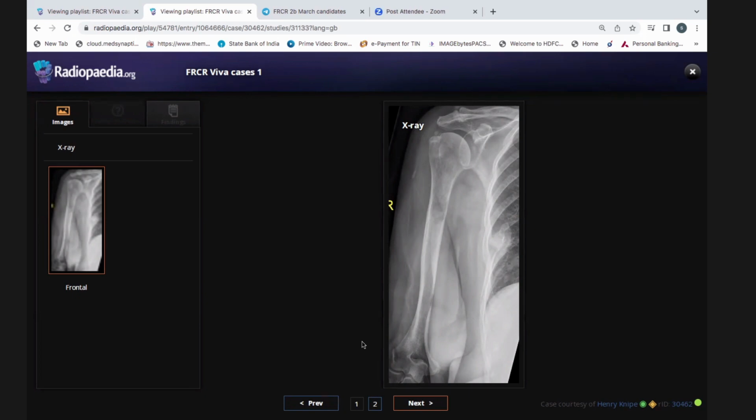Also because there are mild arthritic changes not matching the patient's age, and calcific tendinopathy along the supraspinatus tendon as well, I need to further investigate with a lateral view and other orthogonal views of the right arm. Okay, the orthogonal view was showing some periosteal reaction along the upper shaft of the humerus.